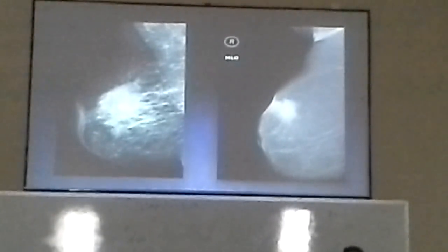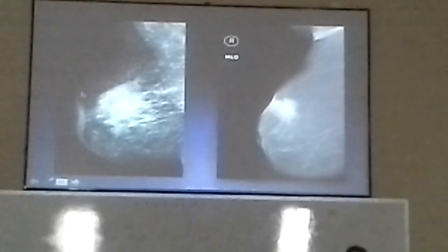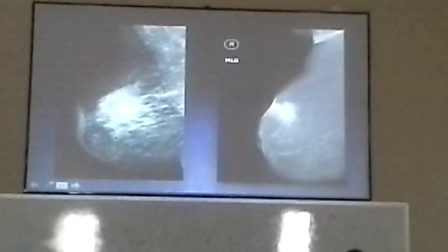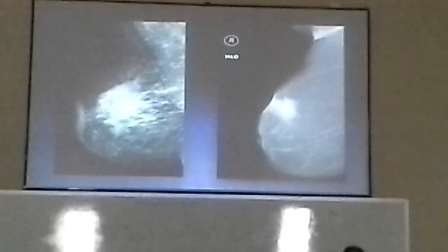This is benign or malignant? So again, here you can see the thickening and some retraction of the skin and a large ill-defined mass, and here you can see distortion and thickening of the trabeculae. These are thickened. So again, this is a malignant mass. For you to remember, if you are shown this, it is a malignant mass.